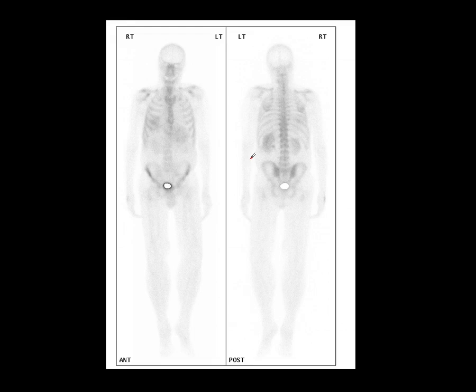So we do have to be looking out for those, because the clinician might send us a patient with the clinical information query bone metastases because they have perhaps chest pain, but we might see a soft tissue abnormality underneath it.